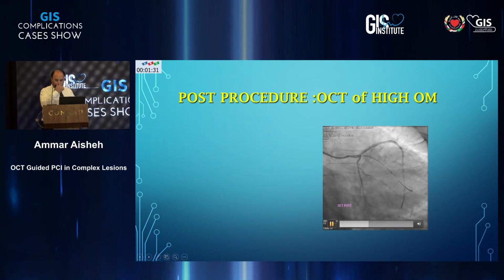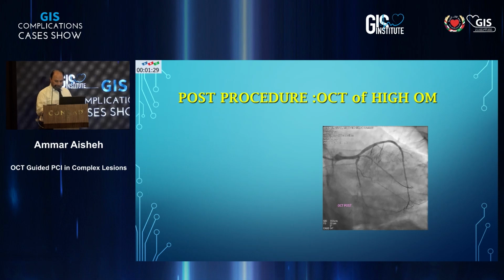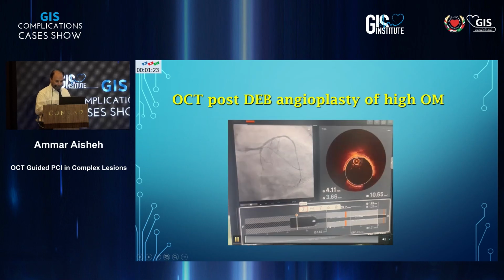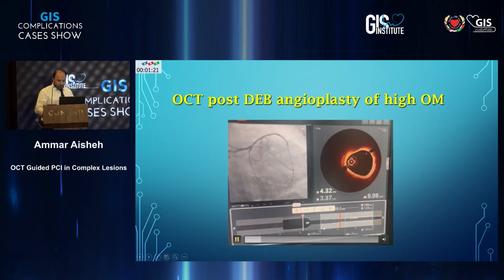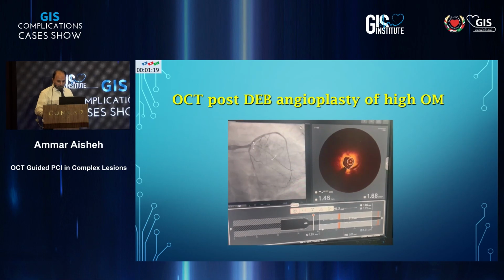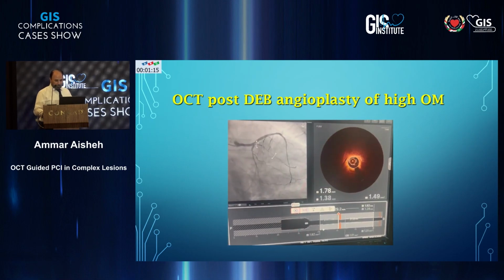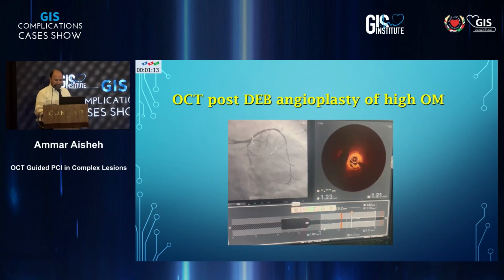We did OCT post-procedure, post-angioplasty. It's an acceptable result.